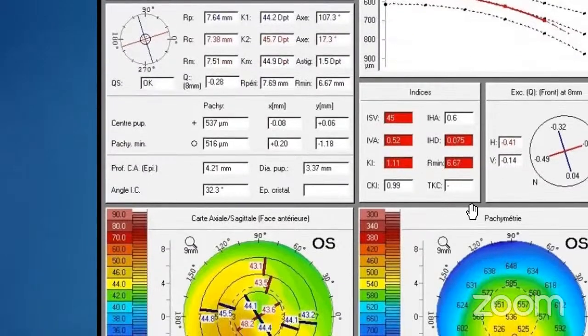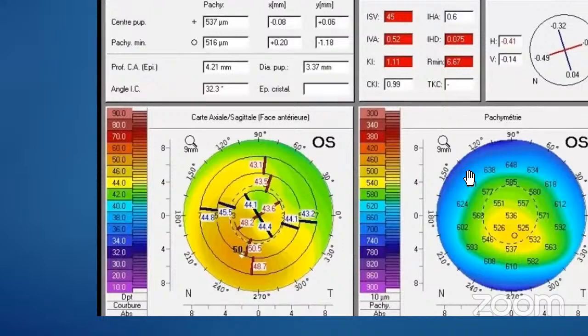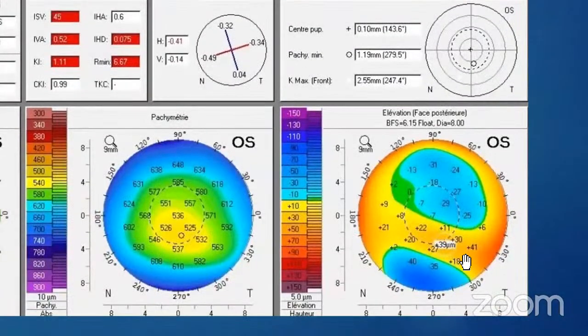And sometimes this overall score comes out here in this box. A couple of the values have backgrounds in red. And when we look at the anterior, as you see, some value is 50 here. Can you see my cursor? Yes, ma'am. Posterior elevation 39 here.